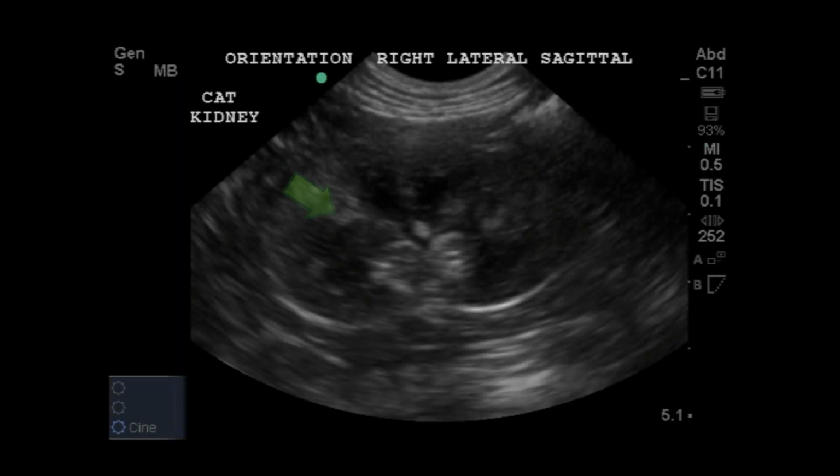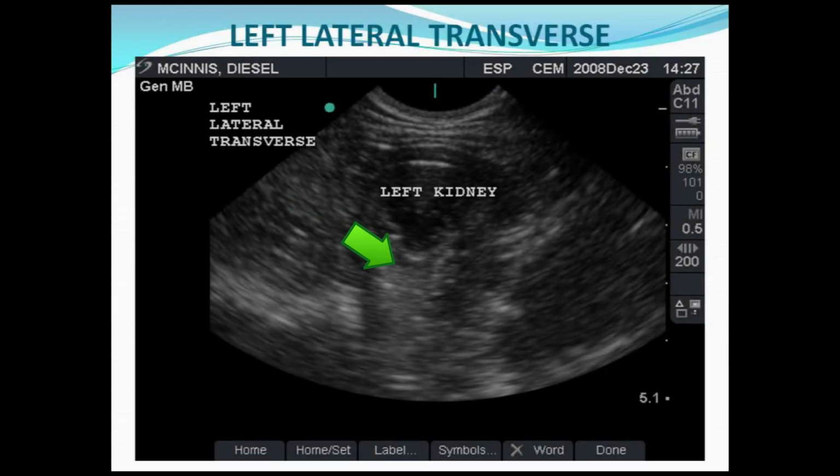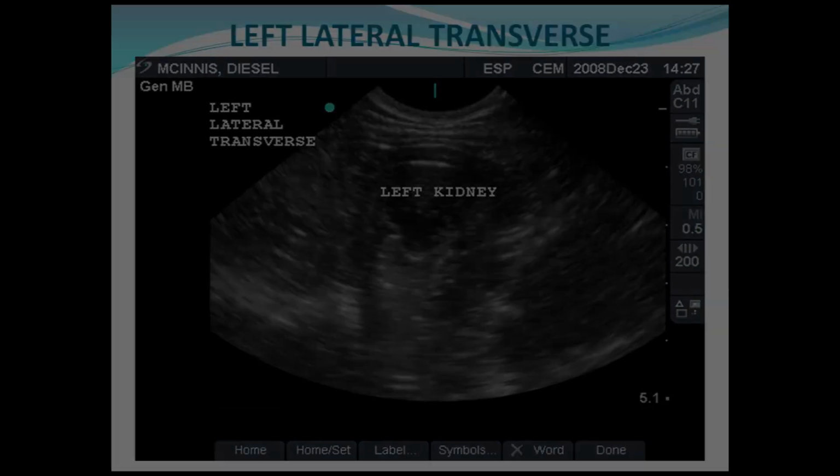The renal sinus usually contains fat, which may or may not cause an acoustic shadow. Fat in the renal sinus usually obscures visualization of the renal pelvis and proximal ureter on ultrasound. Urine flows from the renal crest into the renal pelvis and then to the proximal ureter.